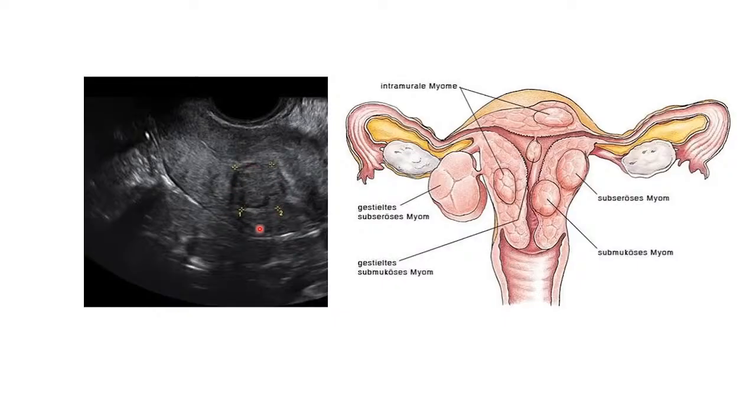Ladies and gentlemen, I've tried to give you a diverse range of how variable fibroids or myomas appear on ultrasound. So I hope we are going to put flesh to the skeleton, read as much as possible, refer to different texts, and also see how other fibroids appear. Also, departments, try to check the type of fibroids, share the findings with your colleagues, and discuss until everything is at your fingertips.